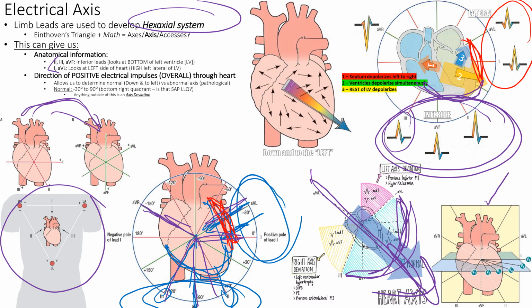So that's why we see the P wave first, followed by QRS. This one just is representing QRSs, so the P waves are not represented here. That's more the electrical travel. Your heart's split in half as far as first your atria depolarize and then your ventricles depolarize. So really we're focused on the ventricles right now. But you can see on your 12 lead which atria is larger. You can see in V1 that you're going to see a much higher spike in the first P wave compared to the spike afterwards, because we know it goes from right to left.